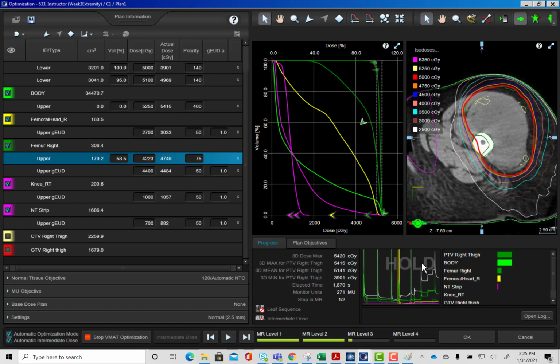The way an optimizer works though is it's all a give and take process. So you almost never are going to put exactly what you want to happen in here. You're going to put something lower than what you actually want to happen in your optimizer in order to actually meet that objective. So again, kind of see what I mean, and as you get more experience and as we move through this course.